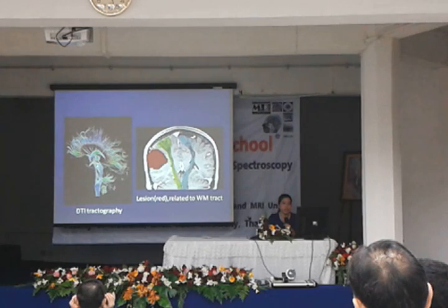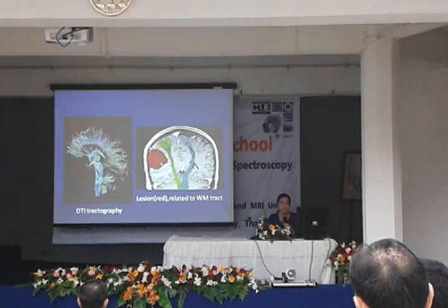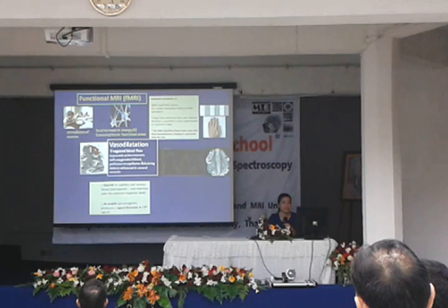This is the DTI tractography, where we can follow the fiber track in our brain, and this correlates with the lesion. The lesion can be a brain tumor, and we can see whether the tumor disrupts this fiber or just compresses from the outside. Compression is better than tearing this fiber, right? Okay. And I will move on to the next advanced imaging, the functional MRI.